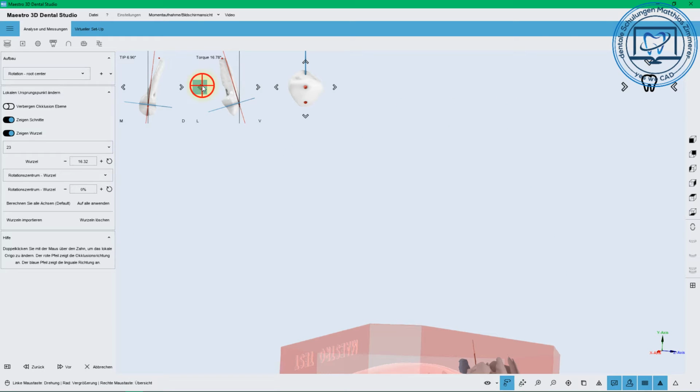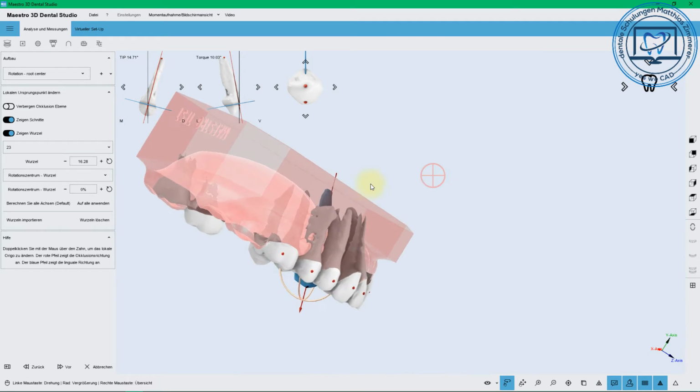When loading the CBCT data, you always have to check it again, and you see on the root this point, and this is your setup for the software. Normally it makes very much sense to have the lines adjusted to this area, so the software will make the right movements at the end. Yes, like you see, just short before the point, and everything is okay.